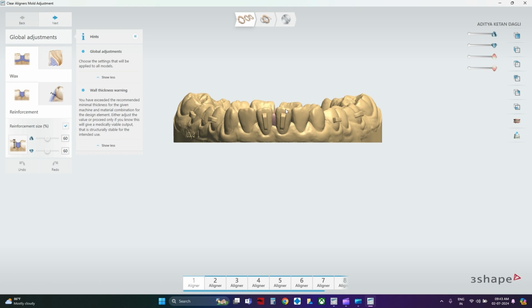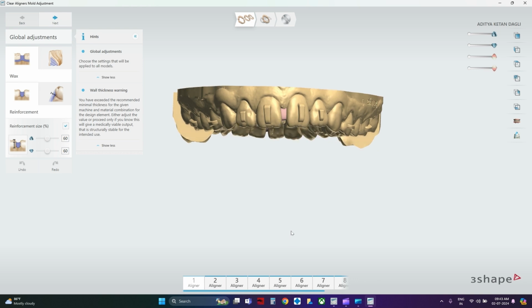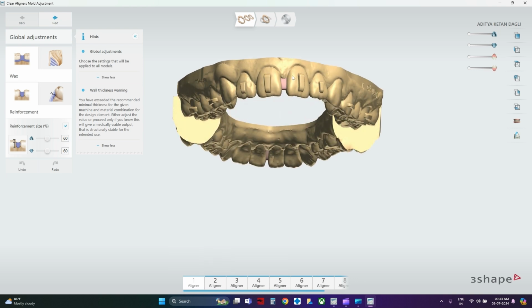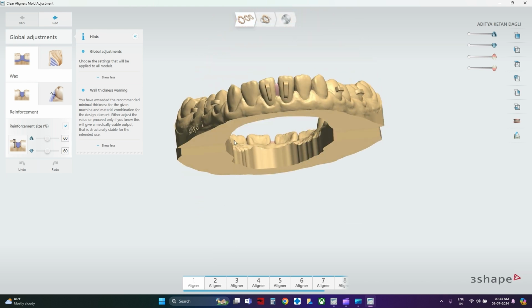Now you imagine that you have this diastema on both the arches, and if you don't block that out, your plastic is directly going to go in between those spaces and it's going to become so thin that if you have an undercut of your incisors over here, it's not going to come out very easily, which you can see over here that it has a very good undercut of this incisor.